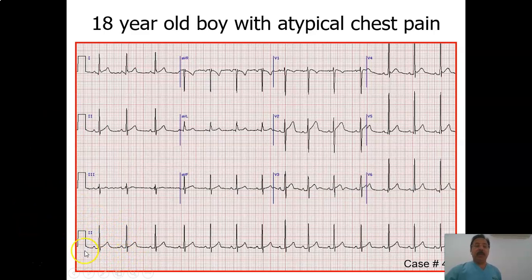The rhythm is very important here. If you look here, there is a P wave followed by the QRS complex everywhere with a 1:1 ratio. So it looks like the rhythm is coming from the sinus node, but it's irregular. So this rhythm is sinus arrhythmia, because of the young age, atypical chest pain, and breathing pattern. This can cause sinus arrhythmia.